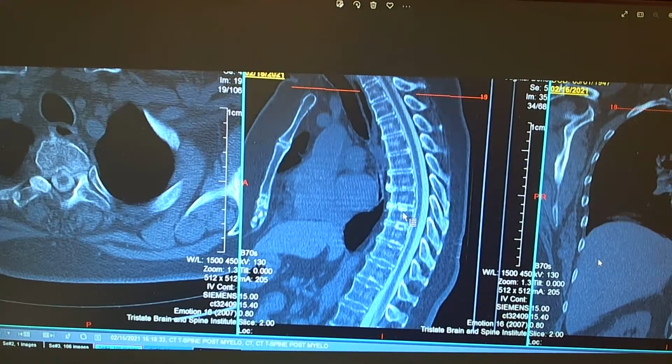That's a good one. So here, this structure, we talked about it last visit. What is that? Who's going to tell me what that is? This structure right here. Trachea. Yes. But if that's the trachea, what is this?